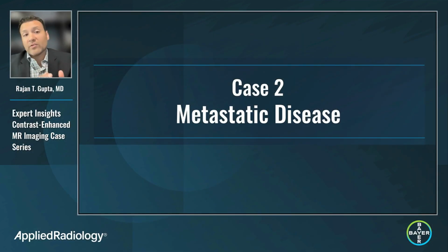Okay, so we've now talked about case 1, which was focal nodular hyperplasia versus adenoma. I'd like to move on now to case 2, which is a case of metastatic disease. It's important to realize that when we think about metastatic disease, the traditional teaching of metastatic disease in the liver is that liver lesions are either hypovascular or hypervascular relative to their background. And that is the teaching that has been used throughout as we try to differentiate tumor types.